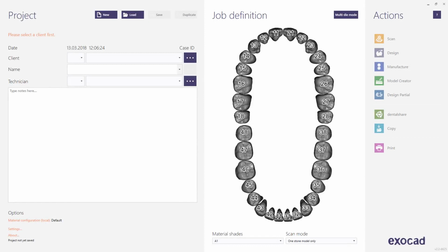This video tutorial from Exocad will show you some of the new functions of Exocad's new release, version 2.2 Valletta. With more than 30 new features, as well as 130 enhancements to existing functionality, the Valletta release represents the largest expansion of capabilities in Exocad's history.